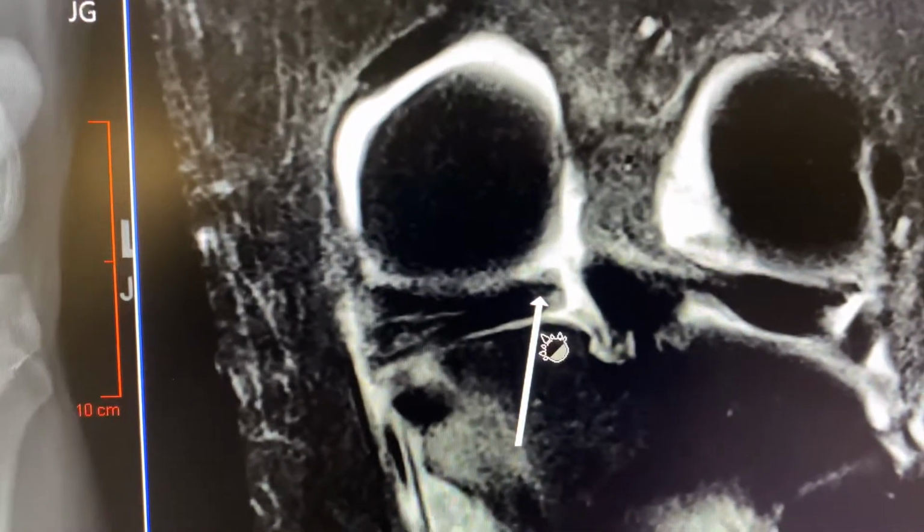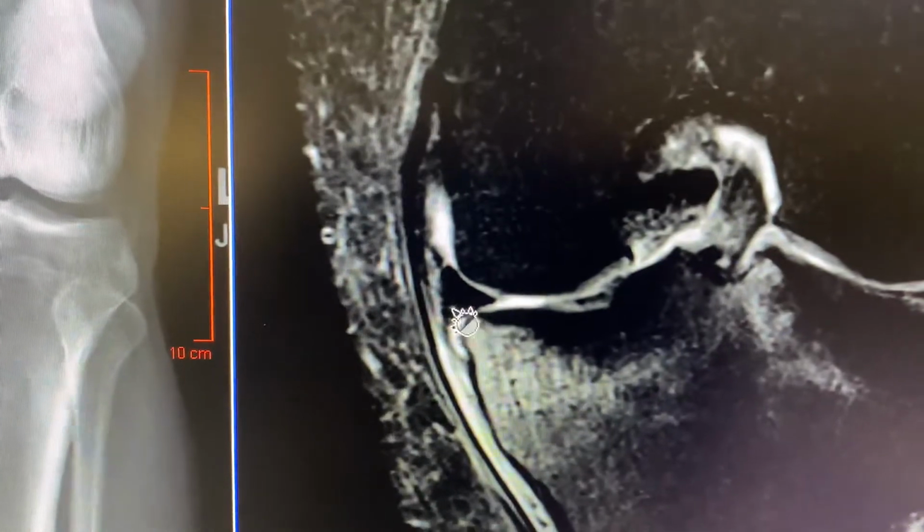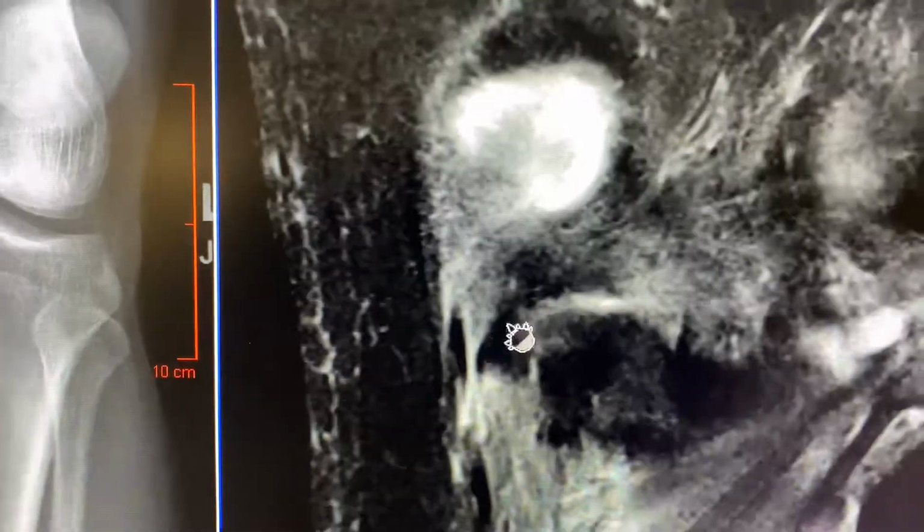So once again, to summarize, bone marrow edema, extruded medial meniscus. Go to the back, look for the gap. It's also not unusual to have a little bit of a cleavage component like this of the meniscus. Sometimes you even see bone marrow edema posteriorly.